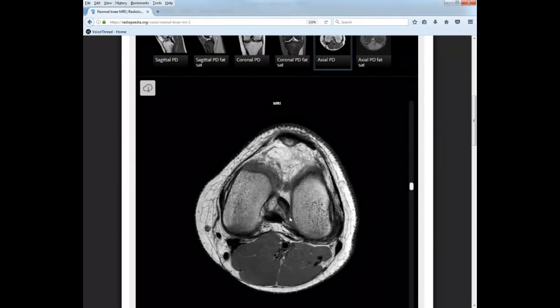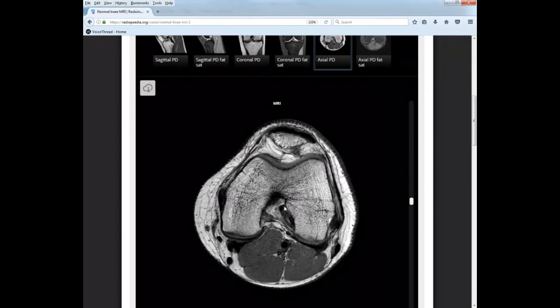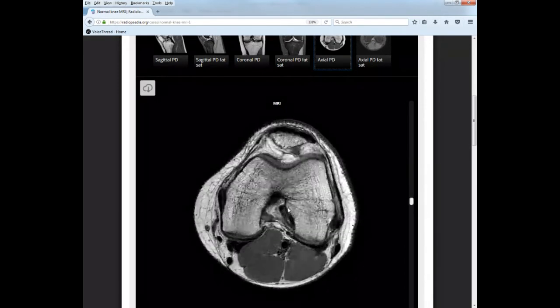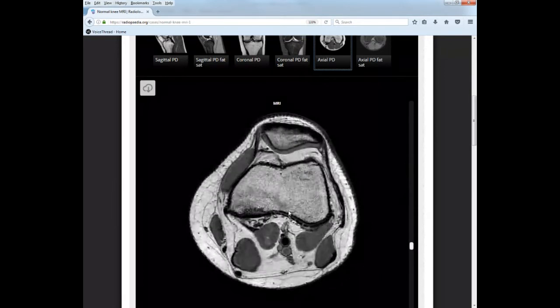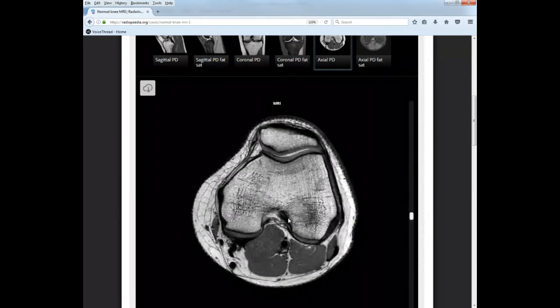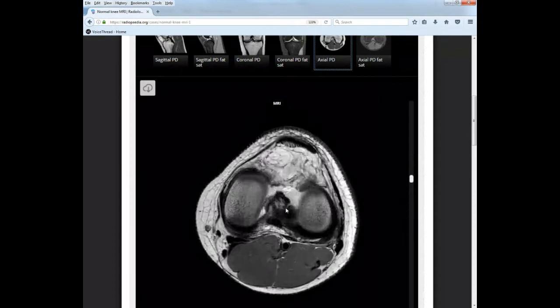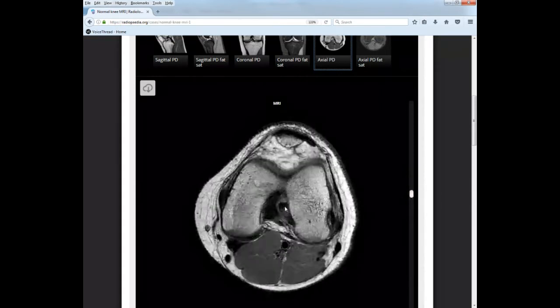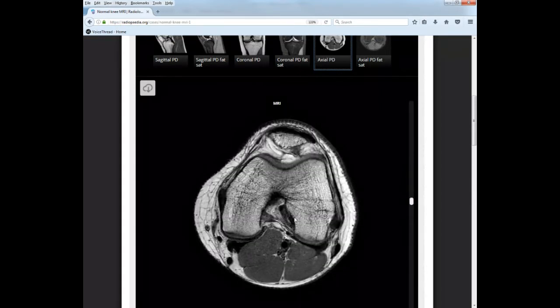ACL over here, this guy. ACL attaches from the lateral femoral condyle, so right here, lateral femoral condyle, to the intercondylar eminence down here. Here's your intercondylar eminence down here. These are the eminence here, coming up to your lateral condyle. All right, so that's in an axial view.